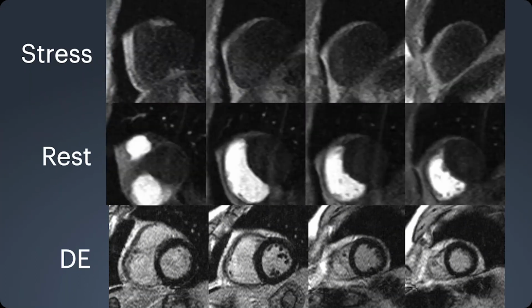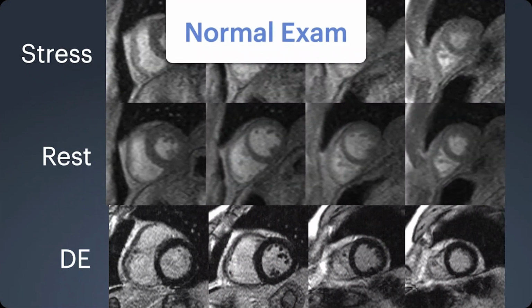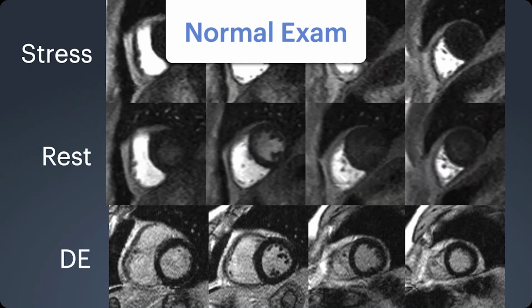So what is our interpretation here? This is a normal exam, so a negative stress test. This patient actually still went on to have cardiac cath, but that was also normal.